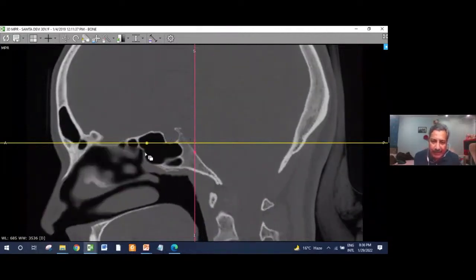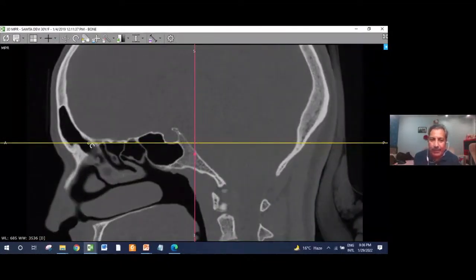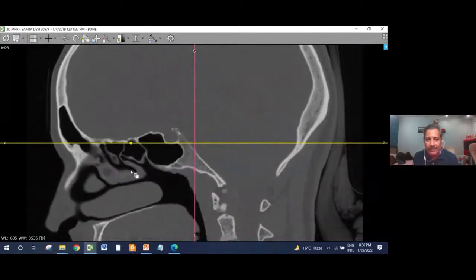If you have an onodi cell, this gives you another good thing. Then the relationship of all the lamellae in the lateral wall, one by one to each other, you can establish best on the sagittal plane. The slope of the skull base. See, the skull base is not flat; it is sloping, and this slope is different in different patients, and this is best ascertained on the sagittal plane.